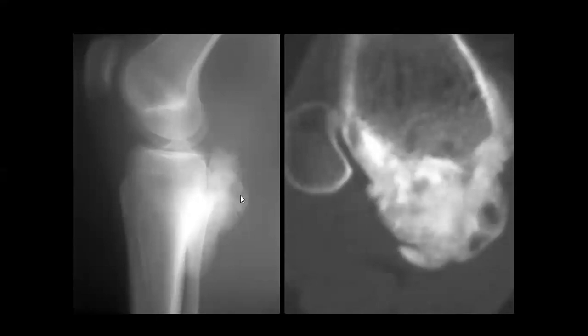So what is the difference between Parosteal Osteosarcoma and the conventional osteosarcoma? It is low grade, yeah. So it's important to differentiate. It has a good prognosis, a better prognosis, so it is important to try to differentiate between it and the other one. Yeah, okay, I agree. And the location, again, it is on the surface.